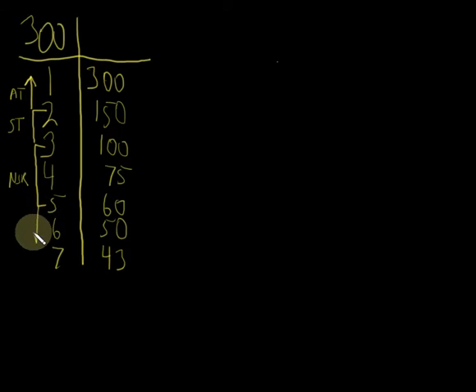And if it's less than a rate of 60, but we met all those other characteristics, we'd have sinus bradycardia. So even with this coarse reading, you're not very accurate with the heart rate, it works. Now, that being said, I do want to show you, because you should be familiar with the other methods, but the primary way you're going to be doing everything for this heart reading, EKG reading in class, just use the 6-second strip method. That works great.